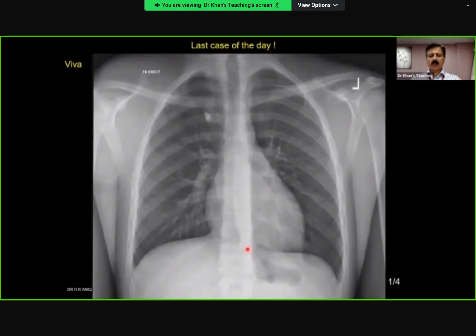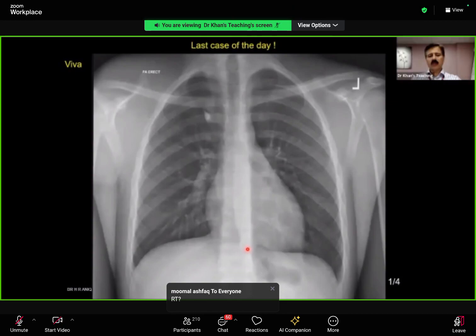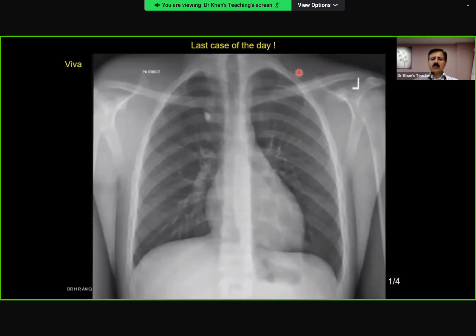Anything happening to the scapula? There's some lucency around the superior glenoid, superior angle. Yes, so the spine of the scapula, there appears to be an aggressive periosteal reaction on the right-hand side. So this is a beautiful film for observation. And if you see here, look at this soft tissue, and you can see normal fat plane here. And then you compare it with this, there is a definite finding.